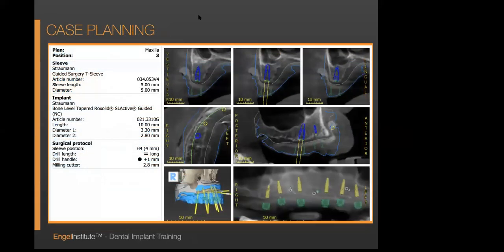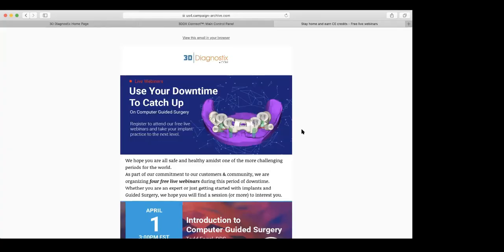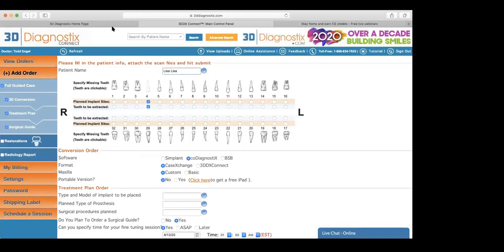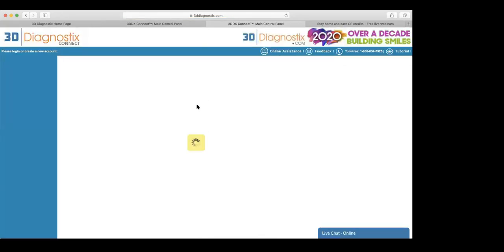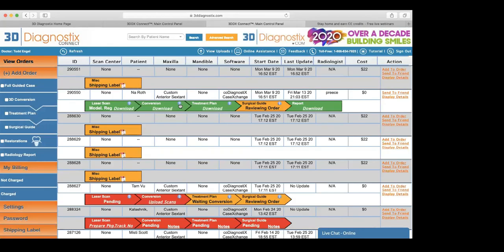Now, I'm going to go to a share screen, and I'm going to go here for a second. Let's see if I can. All right, so hopefully you all can see this. Let's walk through the live interactive. Wow, look at who's that. So what you're going to do is you're going to come up here, you're going to click, okay, and then you're going to get this screen. I'm sorry for my delay. Now, this is going to be your personal login.